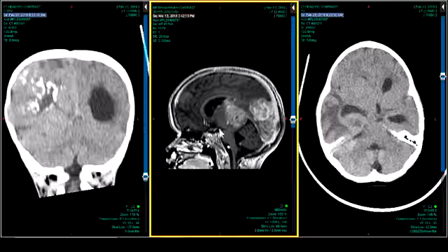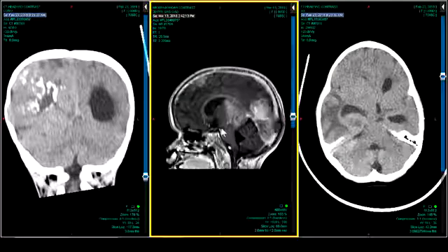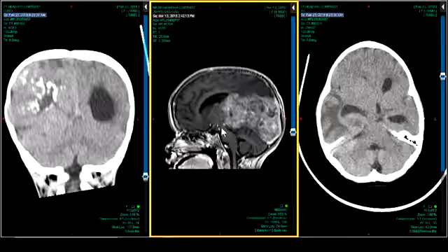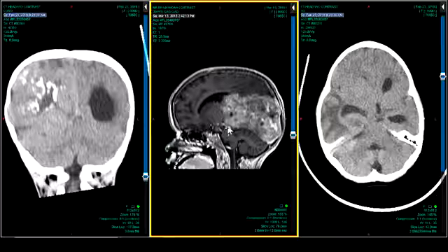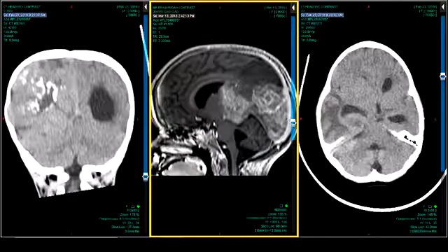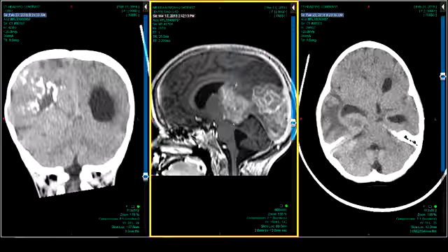Now, they did a biopsy here, and actually it looks like it was an open biopsy, not a needle biopsy, which I think is kind of strange in the sense that, like with this mass effect, you're going to have to decompress. So it seems to me if you're going to go to the trouble of doing a craniotomy, you should try to take some tumor out. The diagnosis is interesting, but really what's on the verge of killing this patient is the mass effect. So you might just do a surgery and figure out what it is at that time, but decompression is going to be a pretty extreme need here.